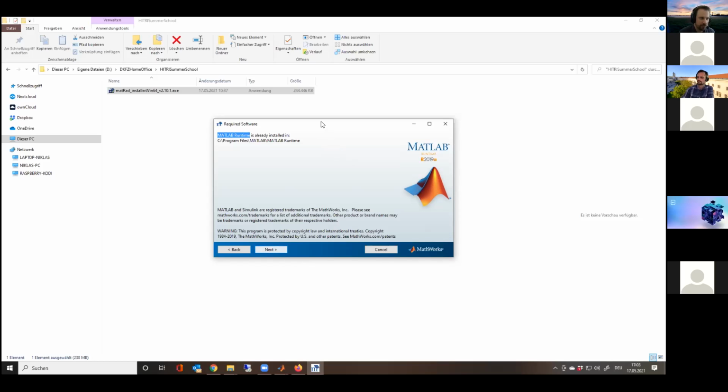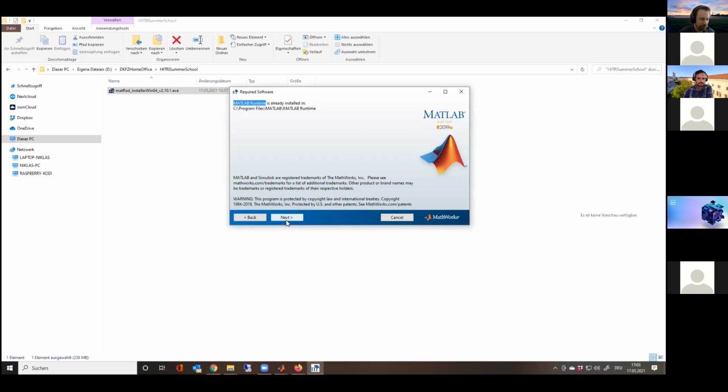for the people that are Windows users, and they will start, if they haven't installed it yet, they will now start downloading the runtime. Some may already have installed it from a previous version or something like that. So then you also wait with me. And I think, Hans-Peter, you show the similar steps until here now on a Mac, okay? Yes, let's do that.